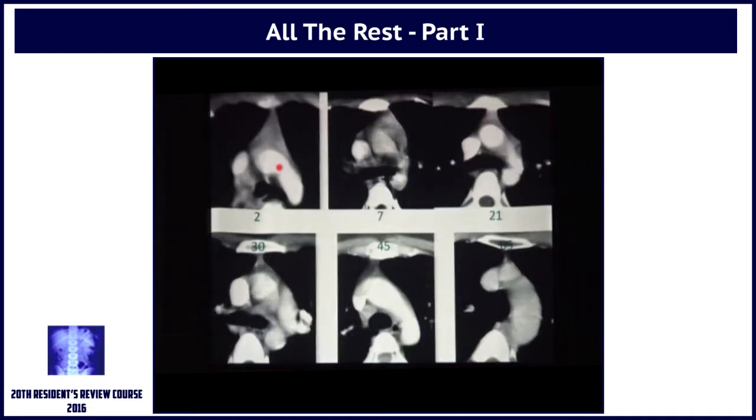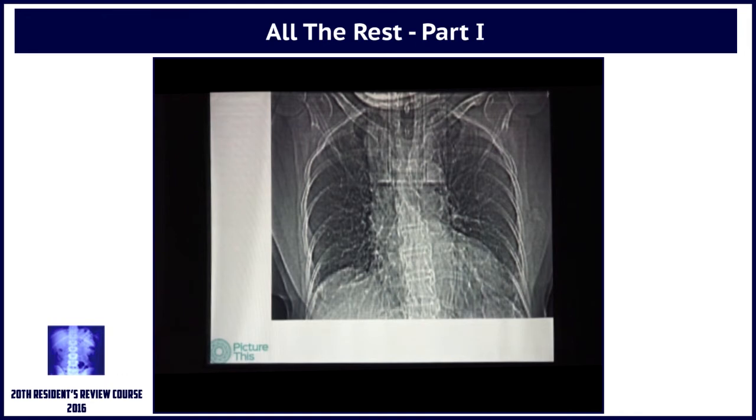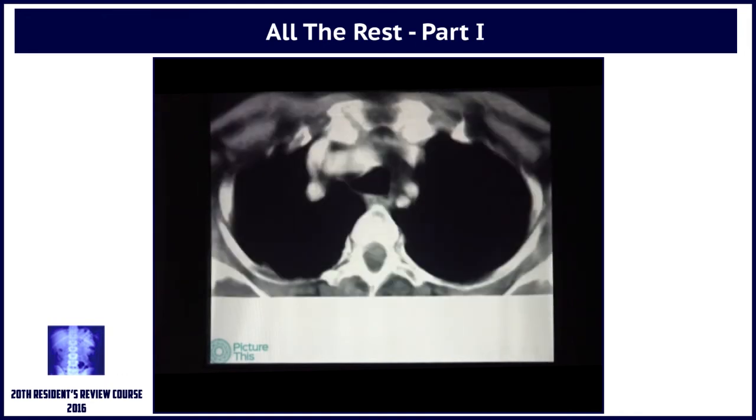Now, this is the way in which the thymus looks with increasing age, and we should be aware of this. Remember, the thymus doesn't grow. So it's the largest single structure in the pediatric population, and then as the body grows, the thymus remains the same, and therefore it becomes smaller and smaller until after about 17, 18 years, you actually start getting atrophy and fat infiltration. The other variant that you would see is the presence of tortuous vessels.